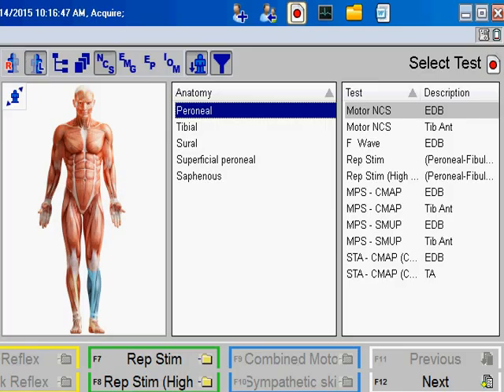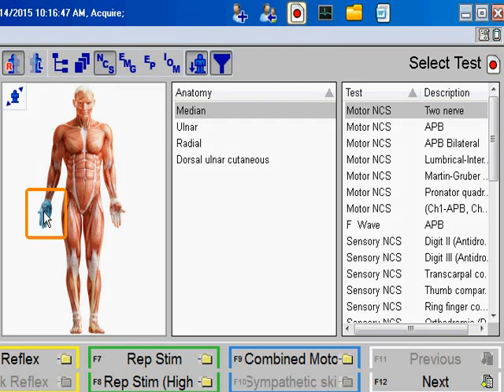One selects the electrodiagnostic procedure as follows. First, we click on the appropriate area of the anatomic sketch. Notice right now we have the left side selected for examination. This is the left side of the patient. When I click on the palm over here, this is the opposite side. The area is highlighted in blue, but also the right side is selected for examination.